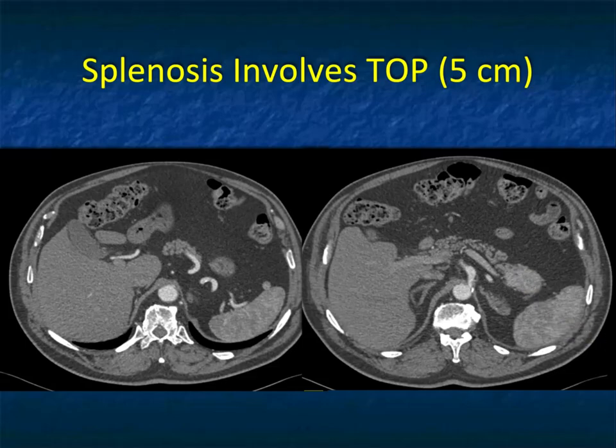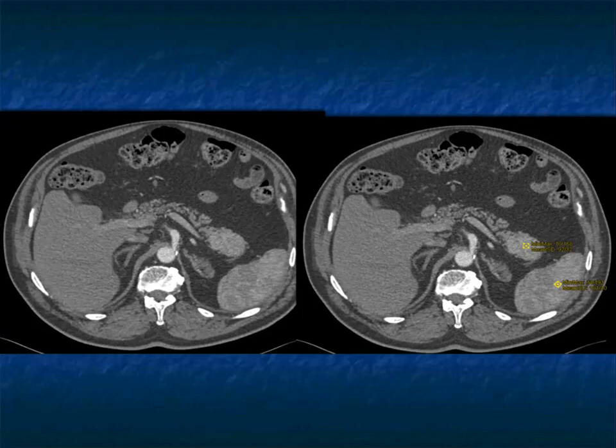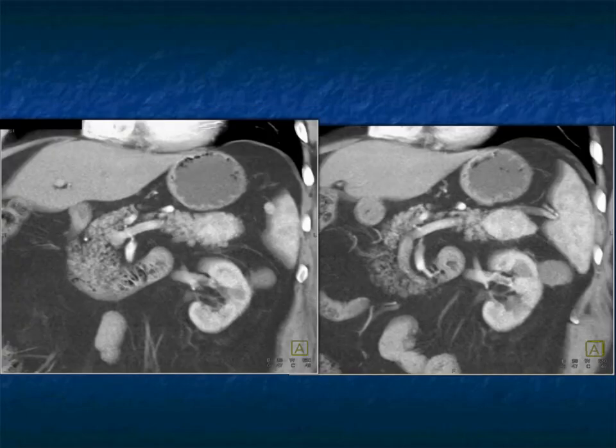But then you look at the spleen and you say, well, it kind of looks like the spleen in enhancement. They both measure around 100, but the appearance, particularly on these images, look how you can accentuate the appearance of the lesion, but it looks very much like the spleen. Now you can say, well, maybe that's just a coincidence. Maybe it's a pancreatic mass.